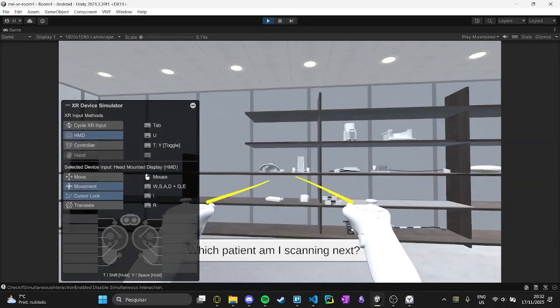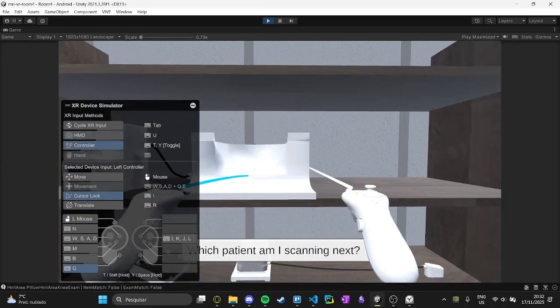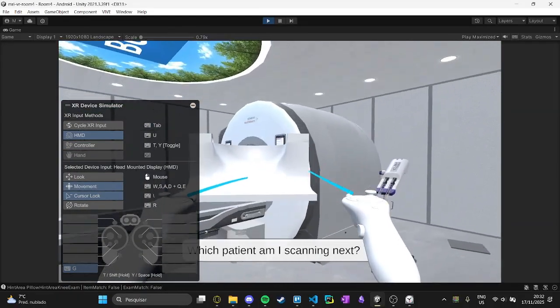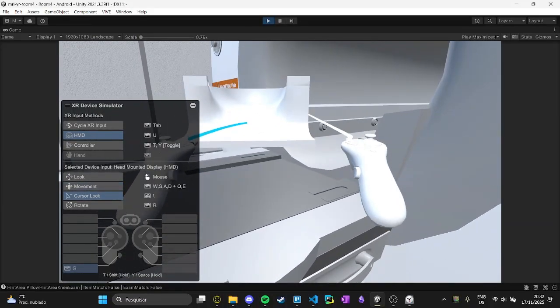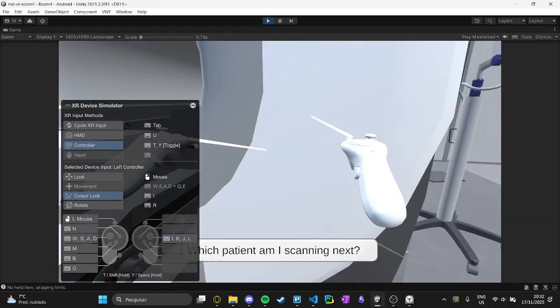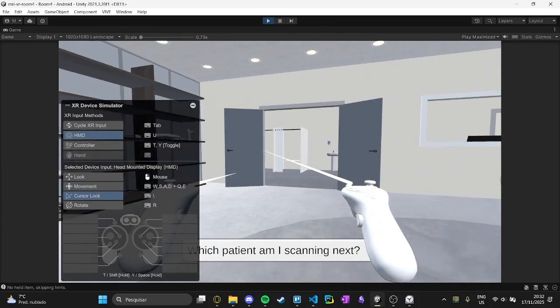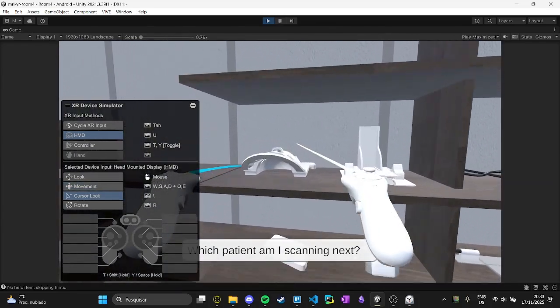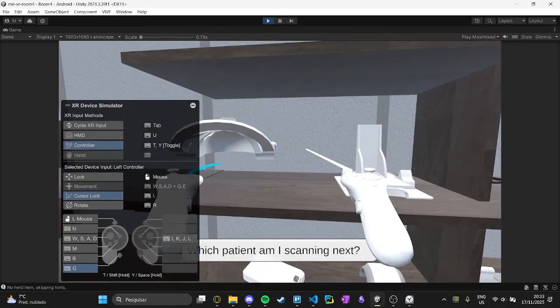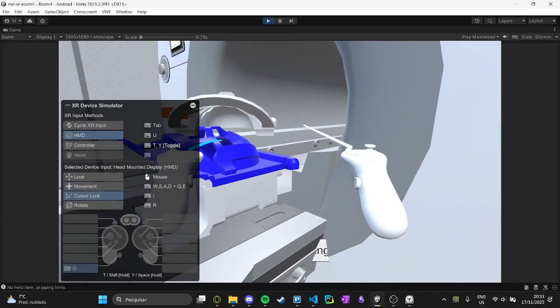Okay, you can now see also that this is part of my contribution, which is being able to grab the head coil and be able to clip it, have this kind of animation. Then you're also able to call the patient in and he has their own animations. I'm also able to clip on this upper part for the exam. Show you here. Yep.